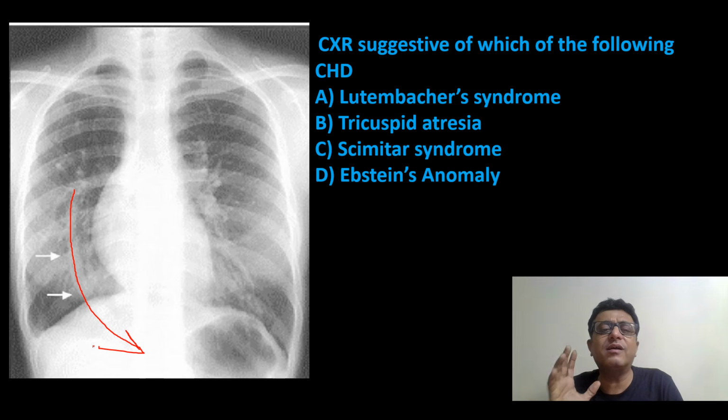So these 5 are the classic ones. There are many more about coarctation, pulmonary hypertension, hyperemic lung fields and oligemic lung fields. In my subsequent classes, I will definitely cover those. But these 5 are classical X-rays in CHD. Egg on side, TGA. Snowman or figure of 8, TAPVC. Boot-shaped heart, TOF. Box-shaped heart, Ebstein. And Turkish sword, scimitar sign, scimitar syndrome. I hope those are clear to you.